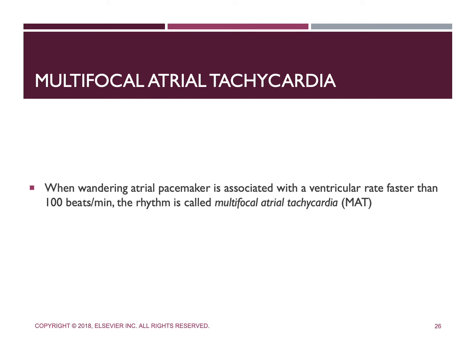When that wandering atrial pacemaker rhythm is associated with a ventricular rate of more than 100 beats per minute, that is when we're going to switch the name of this dysrhythmia. It is going to have a different diagnosis of multifocal atrial tachycardia, or MAT. And this is the result of the random and chaotic firing of multiple ectopic sites in the atria.